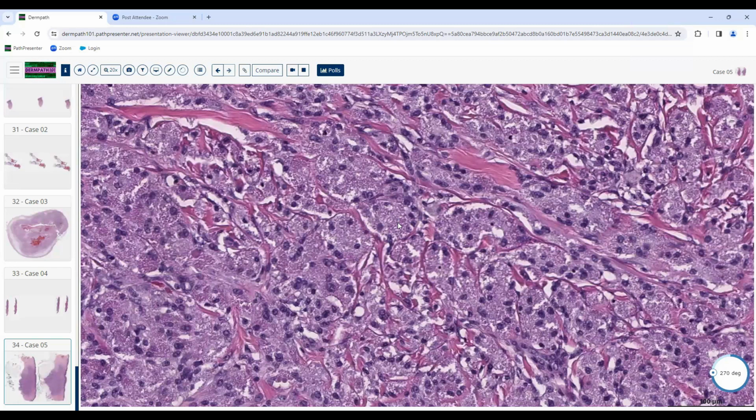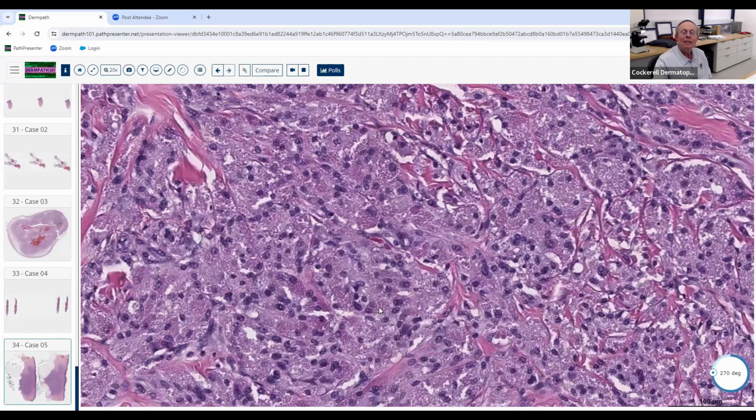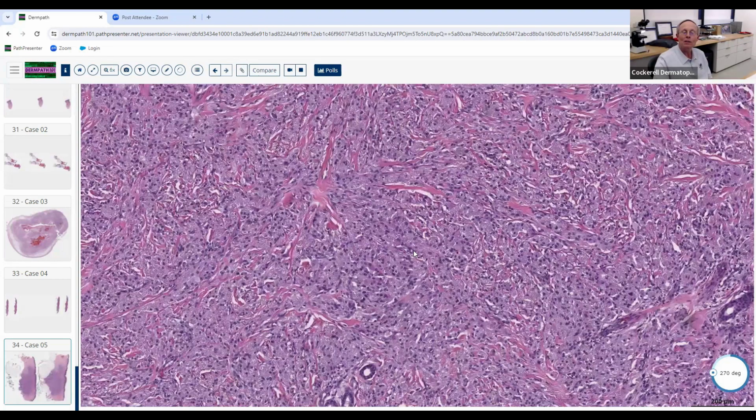It's purple and white, almost pinkish, purplish, grayish. I don't see so much white. You're seeing small little dots, right? So what do you call those? Granules. What's the diagnosis?